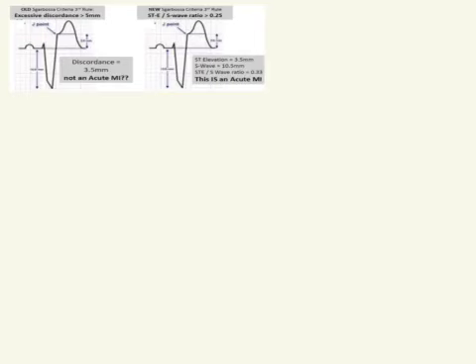Now, the one thing we have to remember is the Sgarbossa criteria says that if we have greater than 5 millimeters of discordant elevation, which is the most common we will see with the axis deviation of a left bundle branch or ventricular paced rhythm, that it's an MI. Well, if we look at this picture up here, we can see we only have 3.5 millimeters of elevation here. But we've got this long S wave.